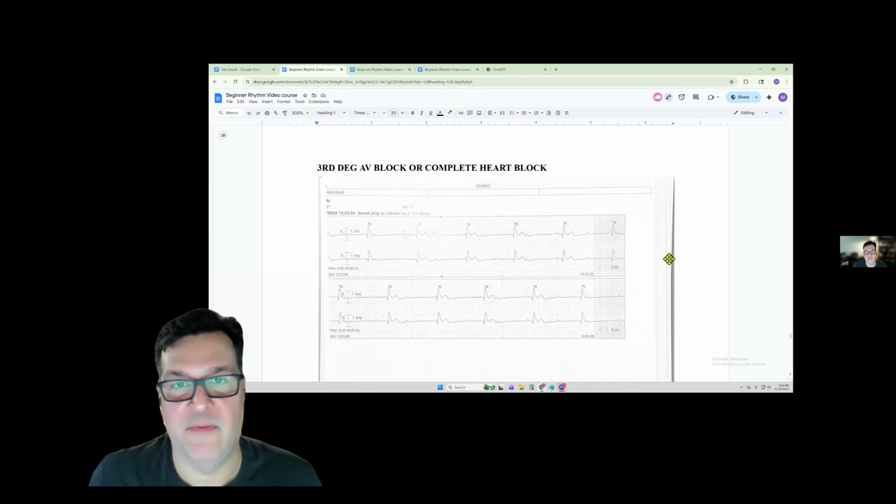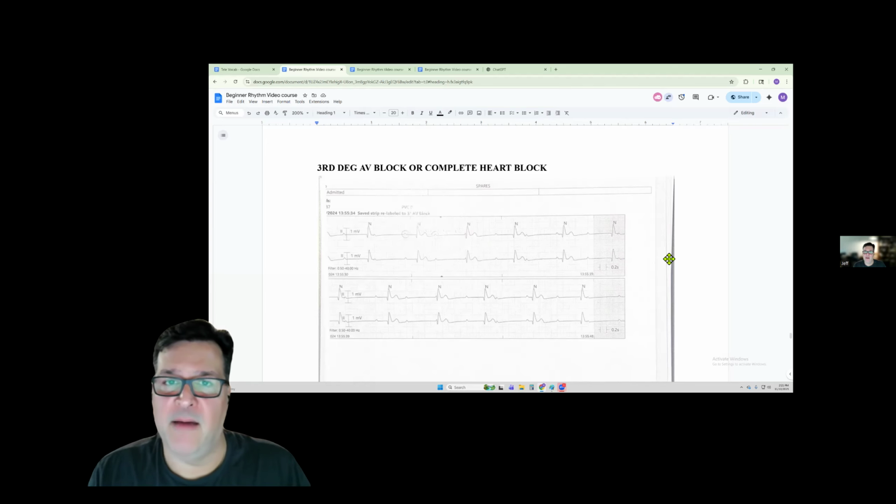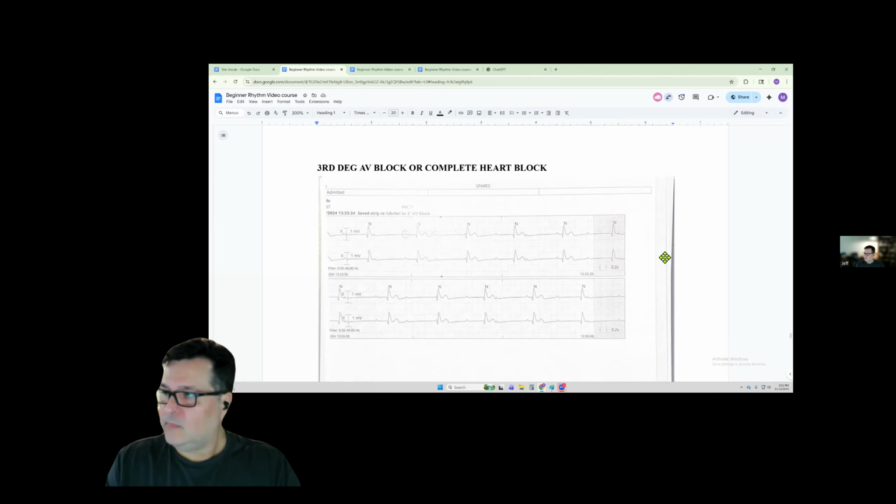But also, you've got to think, if it's blocking every other beat, the heart rate is also being cut in half. So that's also noteworthy. You're going to have a sudden alarm of bradycardia. Like, okay, why are they brady? Why did they get slow all of a sudden? They can still communicate with the nurse saying, I can't tell if it's a type 1 or type 2, but it's cutting the heart rate in half and I got extra P waves.